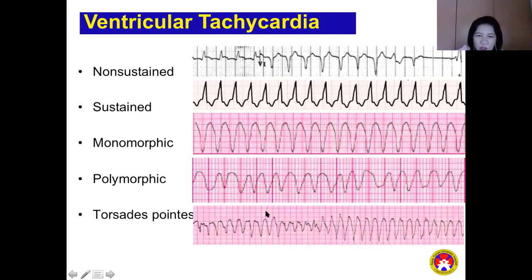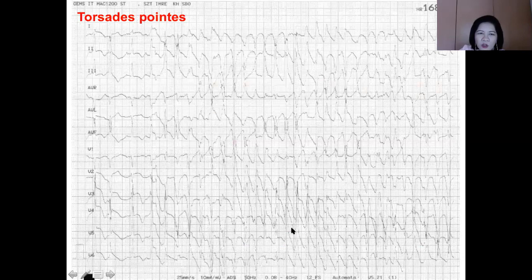And if you see it going up and then down like this one, this is torsade de pointes. It is better seen here. Okay, look at this one. Here, the PVCs occur one after another, so you call it ventricular tachycardia because the rate here is less than 300 but almost 300, around 250.